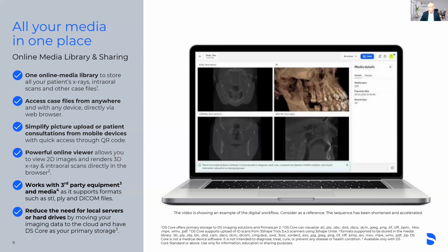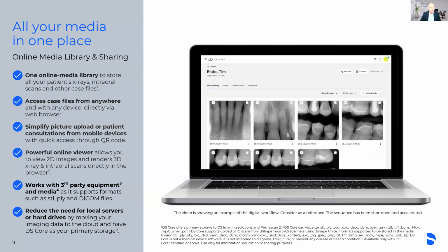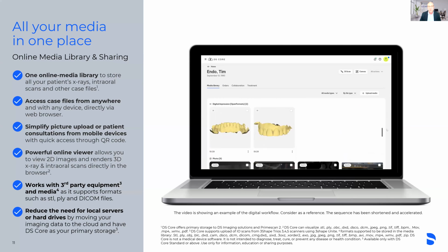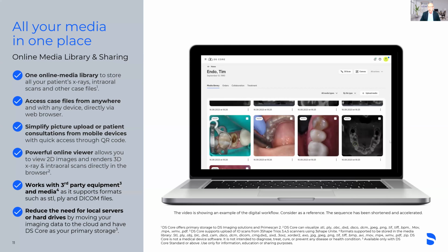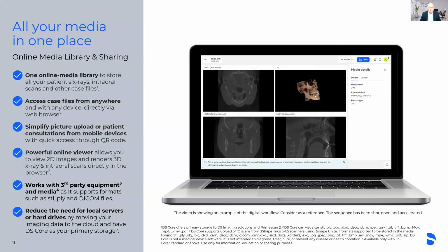So this is what it looks like with all of your media in one place. So we have an online media library, which allows sharing as well. So you're bringing all of your x-rays, your intraoral scans, any case files that you have for a patient are going to be uploaded into DS Core. So now you can quickly access them and be able to share them efficiently.